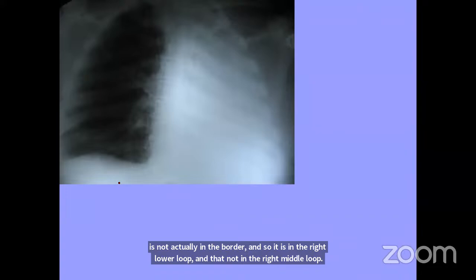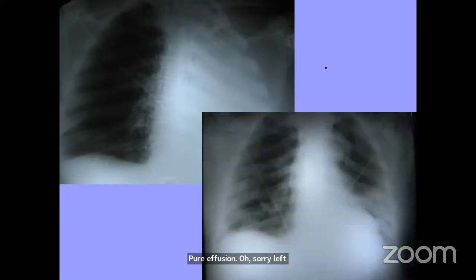Now, this is an X-ray I have specifically put to understand the importance of rotation. On this X-ray, you will feel that the patient is actually having a right pleural effusion, left pleural effusion, but actually it is not so. As you can see, a very well rotated film taken shows that actually there are very few lesions on the left lung and the heart is actually normal. There is nothing much wrong in this X-ray. So, the importance of rotation.